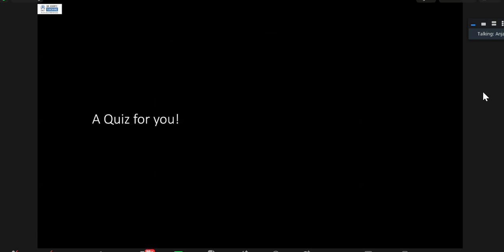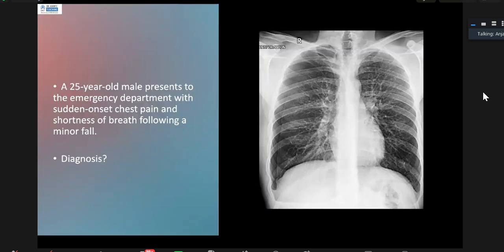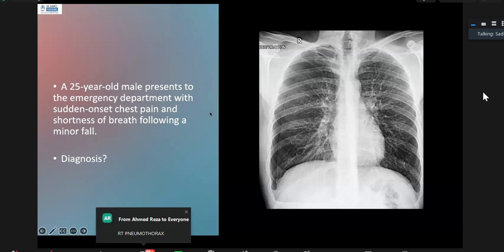Now, before we start pleural pathologies, we have again a quiz for you. And over to you, Sadia, for the first question. Thank you, Dr. Sujit. So much like the first quiz, we're just going to give you some questions, 20 seconds, and then we'll go over the answers after Dr. Sujit has her teaching component. So for the first one, a 25-year-old male presents to the emergency department with sudden onset chest pain and shortness of breath following a minor fall. And you have 20 seconds just to have a look.